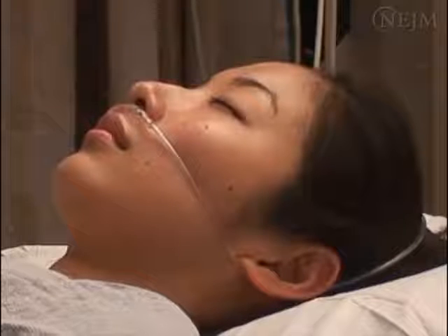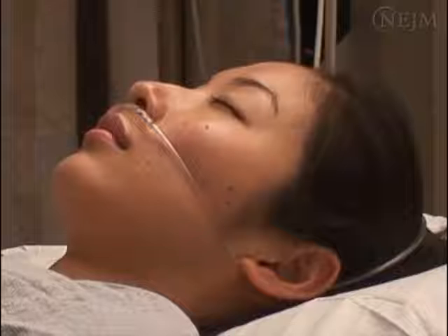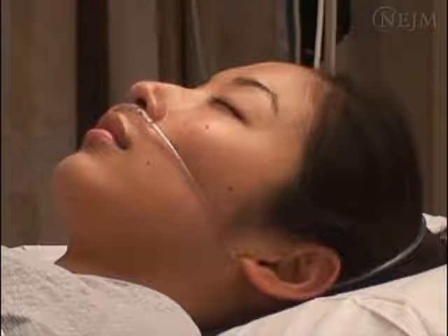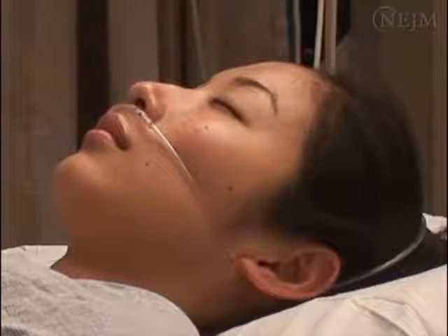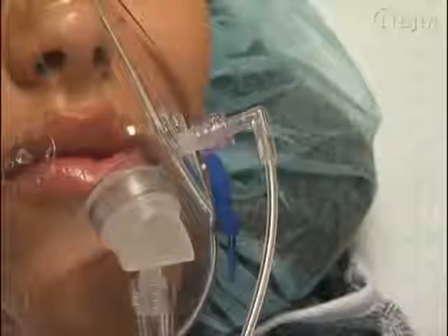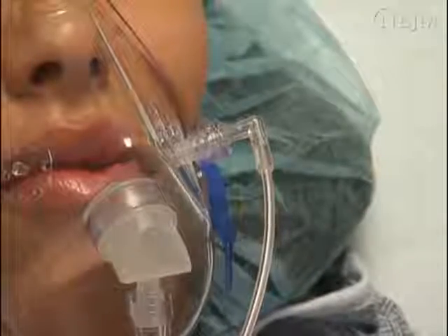However, in patients who are not intubated, sidestream capnographs can be used conveniently with a face mask or nasal cannula to monitor respiration. Nasal cannulas and face masks that feature integrated CO2 sampling are commercially available.